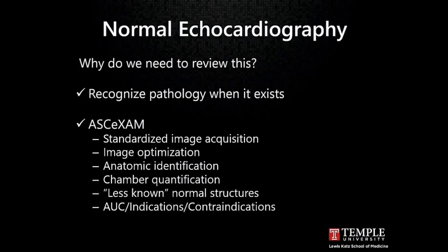In terms of the exam, the goal for the normal echocardiogram and testing it is to standardize image acquisition. Can you recognize the standard protocols? Can you optimize your images? Can you identify simple anatomy? Can you quantify chamber volumes and dimensions? Can you identify some of the less known normal cardiac structures? Like I said, recognize pathology when it exists.